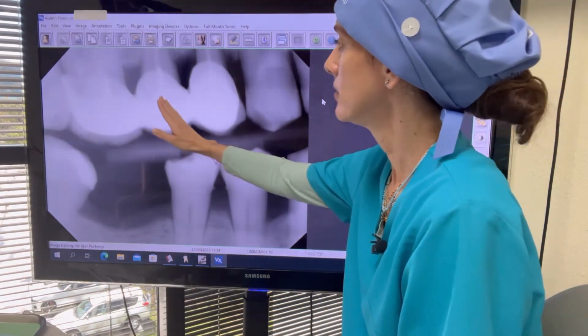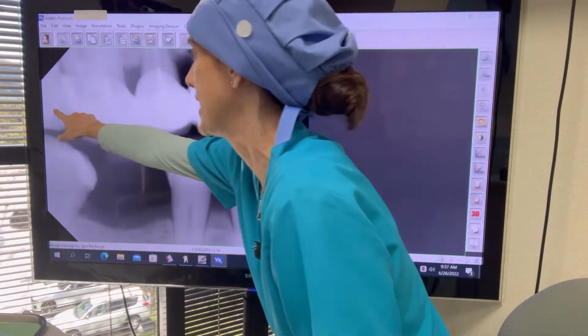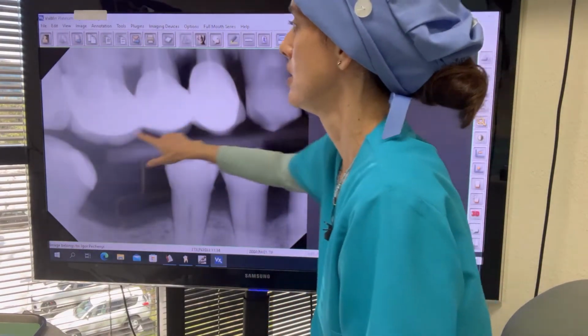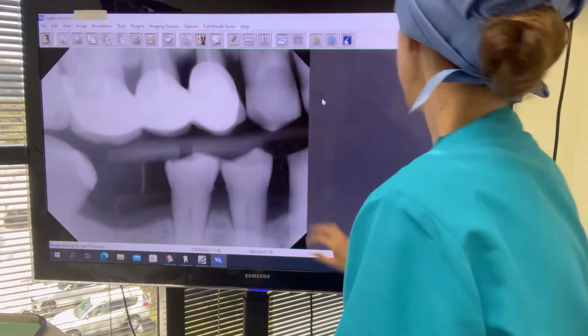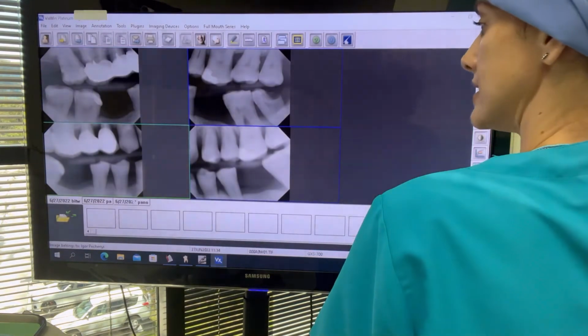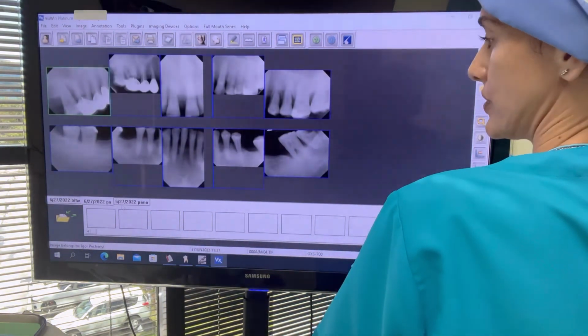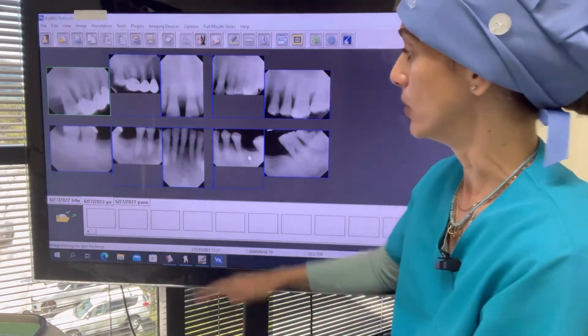One single crown, and remember here we're going to put an implant because we cannot bridge from here to here when the state of that tooth is not good at all. So this patient is on his way to recovery. It's very important to diagnose everything. Very important to stop the bone loss.